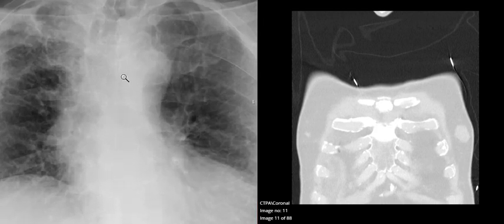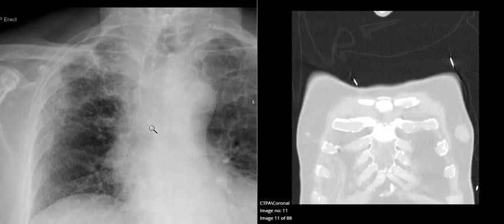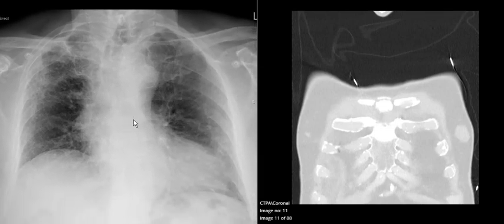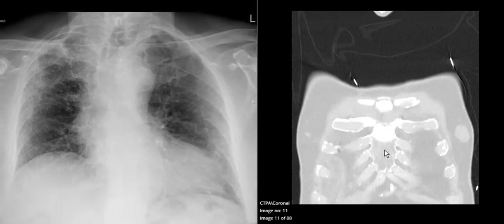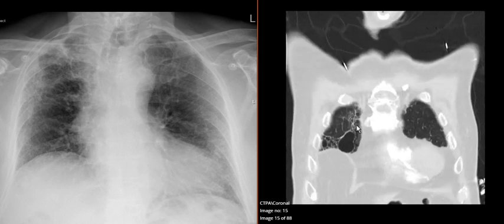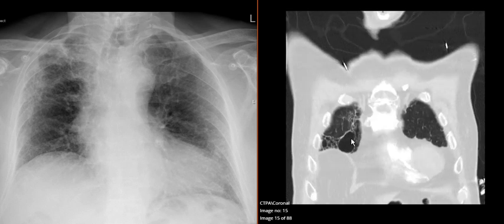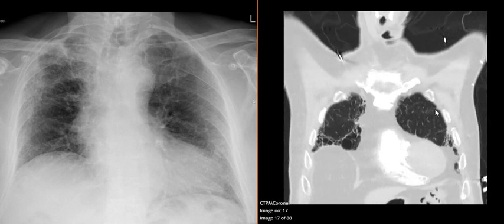If I embiggen this a bit, to some degree, you can see this almost looks a little structural, like some walls and voids. But yeah, it's not a normal pattern. But if we bring that into context, you've got the sternum in the middle here, and then the ribs coming off, the clavicle coming off up the top here. But if we look, there's these holes, walls and voids, so empty space and fibrotic changes around the lung. On his right, more so than his left, but a lot of empty space.